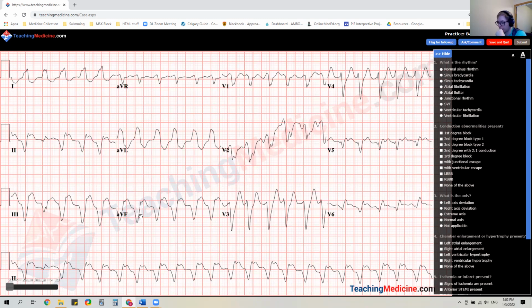Wait, rhythm. Oh, rhythm. This would be ventricular tachycardia with the really wide QRSs. So VTach.